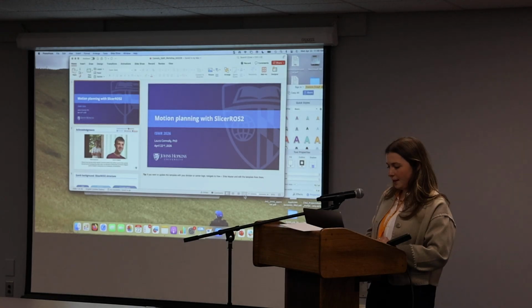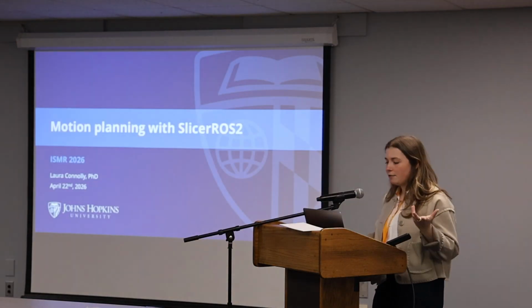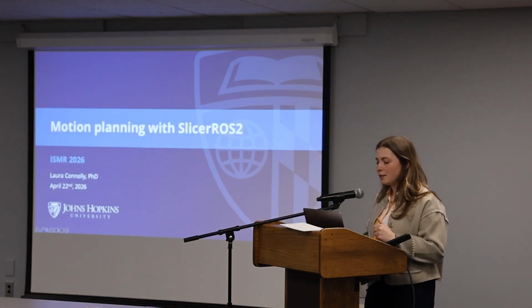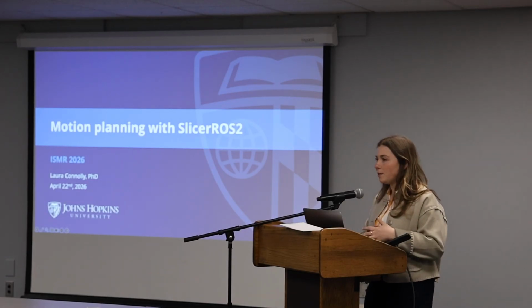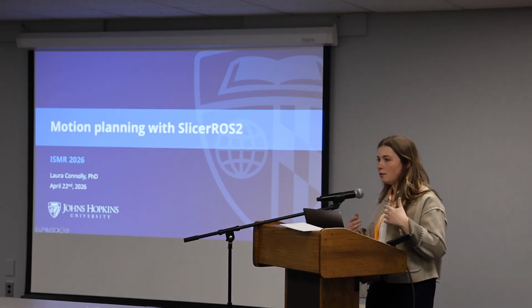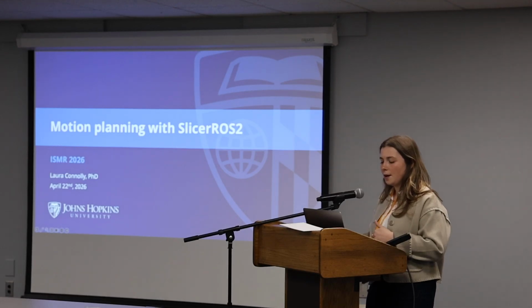There we go. So since then, we've been trying to extend it to have more out-of-the-box tools directly available in SlicerROS. The first one that came to mind was motion planning. So that's what we're going to be trying out today. You don't need any of the setup from the previous hands-on. So if you're just joining, you should be able to start following along in the container now.